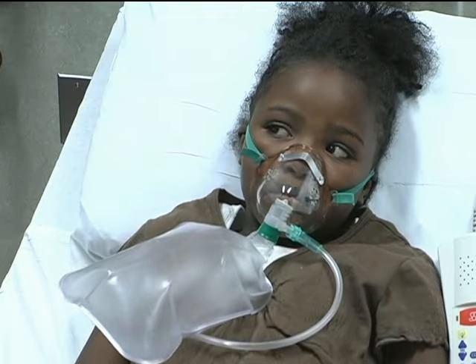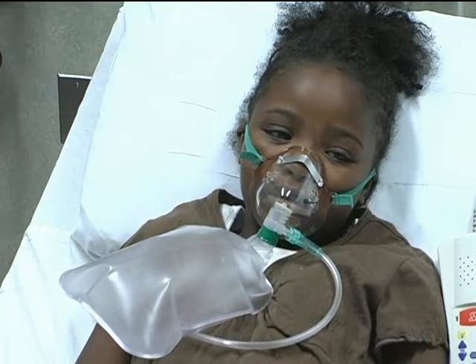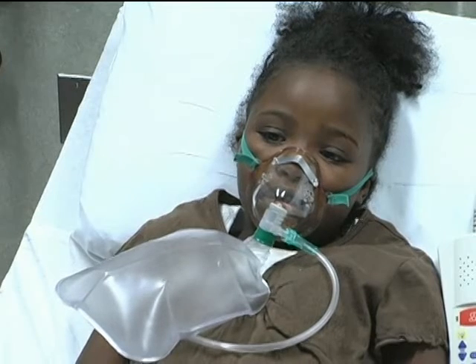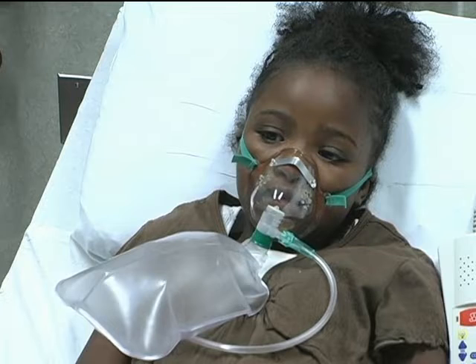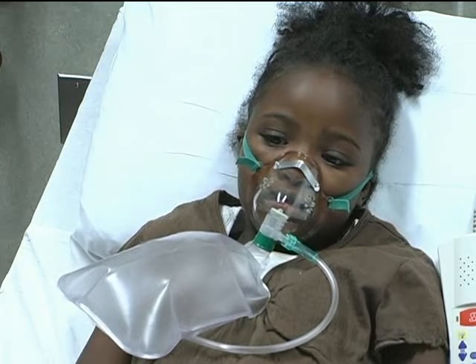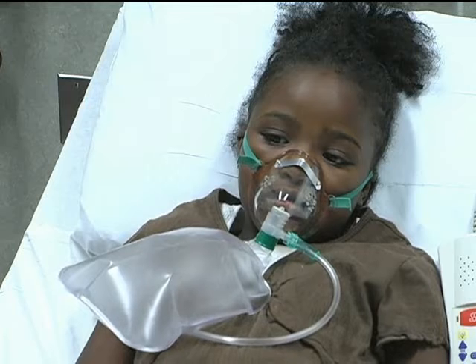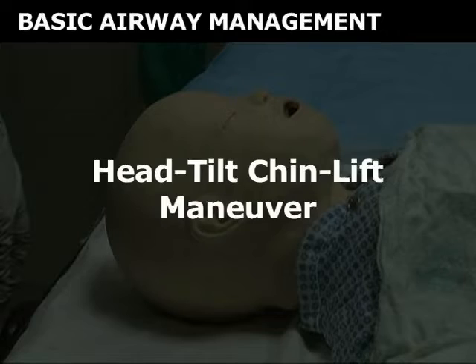Basic airway management can be a life-saving procedure in pediatric patients. The first step in the assessment of critically ill or injured children is an evaluation of the patency of the airway and the adequacy of ventilation. For spontaneously breathing patients with a clear airway, resuscitative efforts may focus on oxygenation.